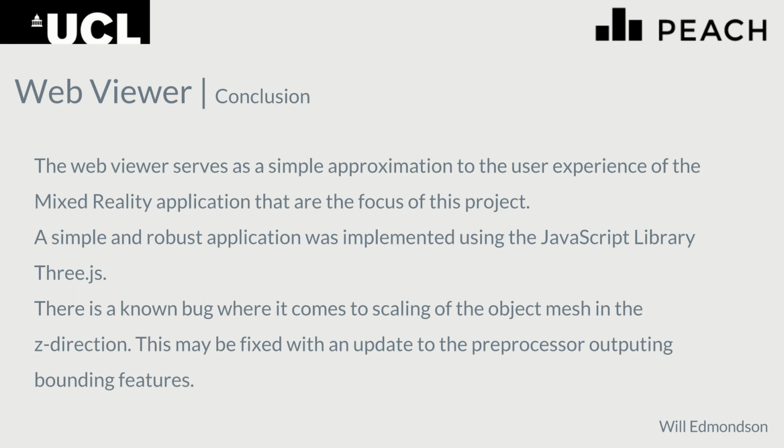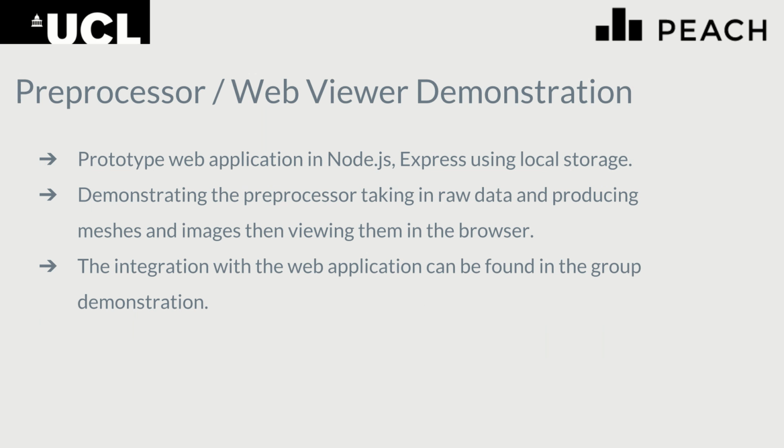The web viewer serves as a simple approximation to the user experience of the mixed reality application that is the focus of this project, a simple and robust application implemented using the JavaScript library Three.js. There is a known bug when it comes to scaling the object mesh in the Z direction. This may be fixed with an update to the preprocessor output bounding features.